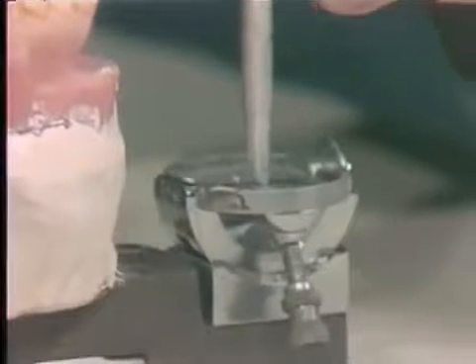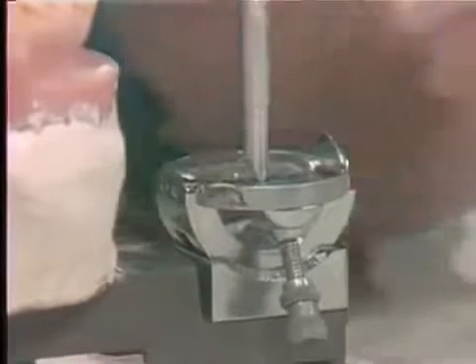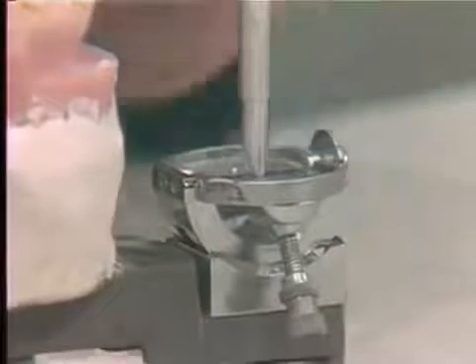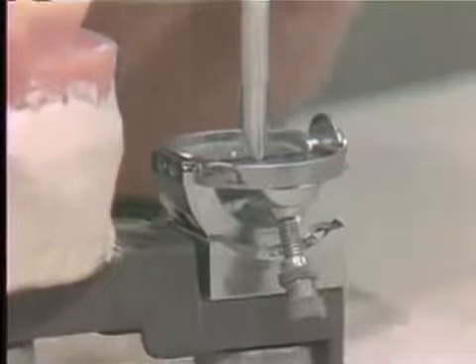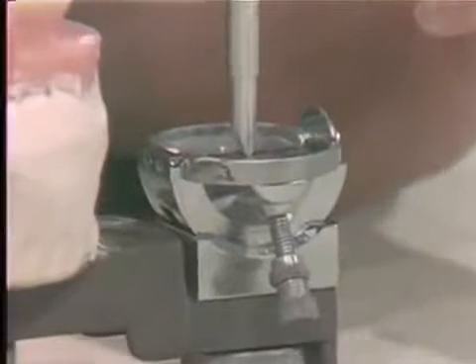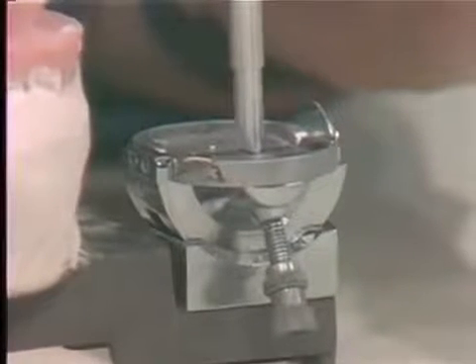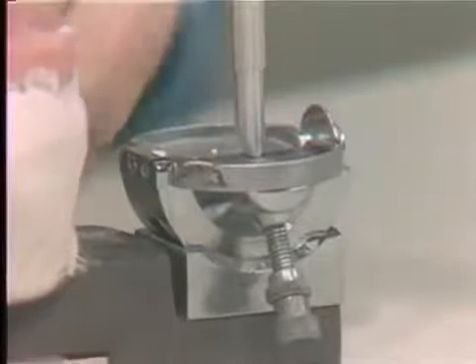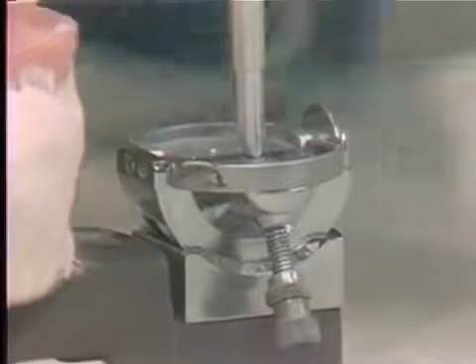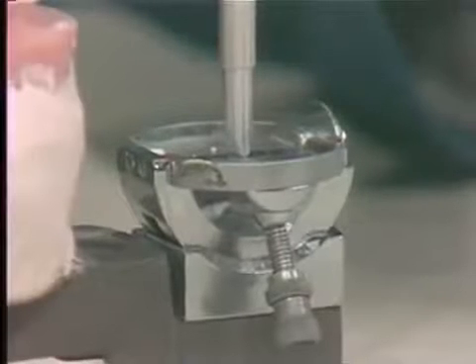Now this relates to the thickness of your centric relation wax bite. So when you take your centric relation wax bite, you're going to have a certain thickness between the teeth, and we'd estimate it to be somewhere in the neighborhood of 3 millimeters. So you then would want to drop this pin about 3 millimeters so that when you put your bite in, and then when you remove the bite so the teeth come together, the pin would be centered again.